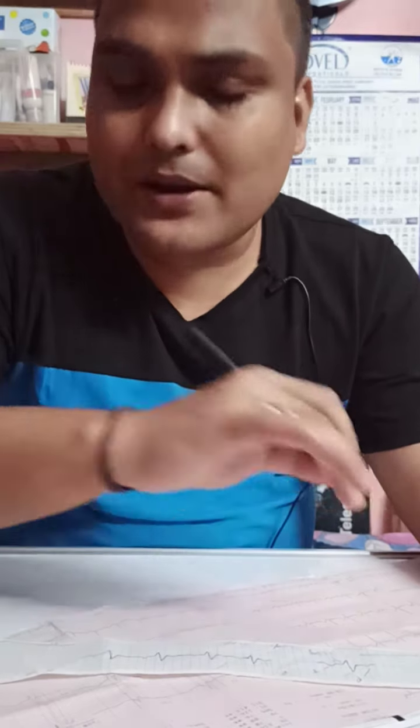The ST segment is very important because this is the isoelectric point. At this point, the heart is electrically neutral. All the ventricular and atrial muscle has depolarized. Now there is a pause, then they are about to repolarize.